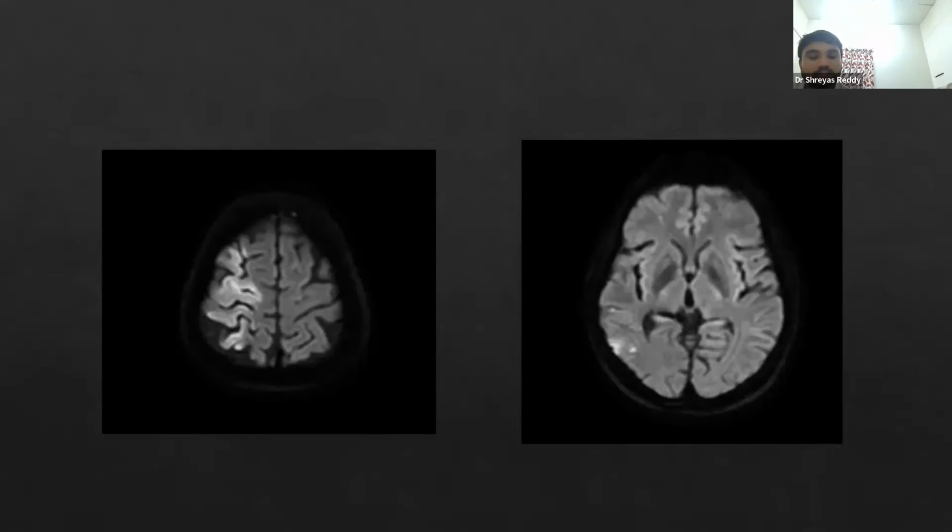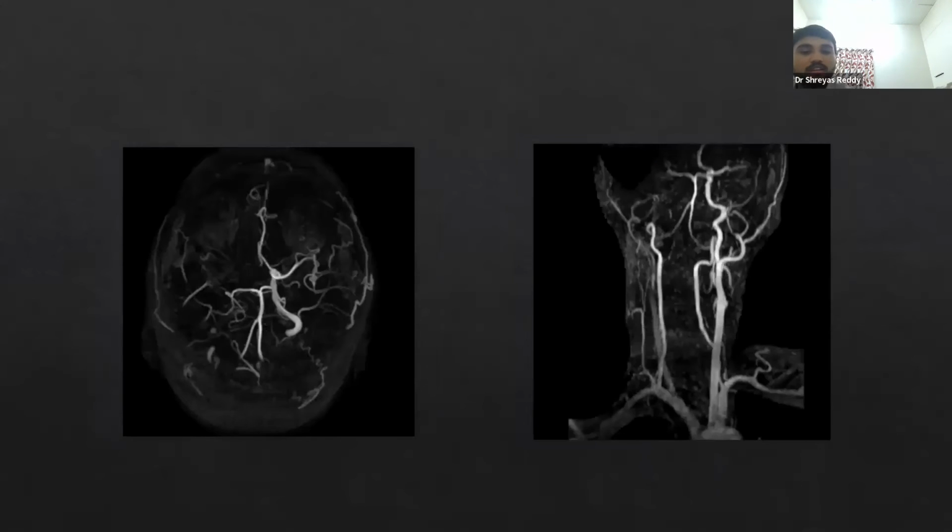Okay, can you go to the next slide, please? Can you interpret this MR angiogram? This is the MR angiogram reformat, which is showing absent flow signals in the right ICA. But you do see the common carotid. Common carotid, yes. What are the first diagnoses that would come to your mind when you see a picture like this? I would think of an ICA thrombus. ICA thrombus, and one more very important condition: ICA dissection. ICA dissection, or an acute or floating thrombus, can sometimes lead to a picture like this. Of course, a dissection will show a bright signal in other imaging sequences.